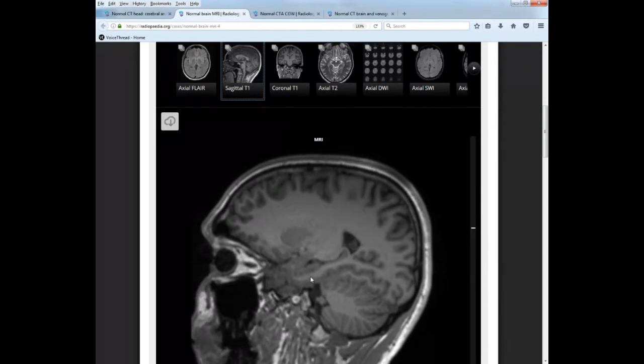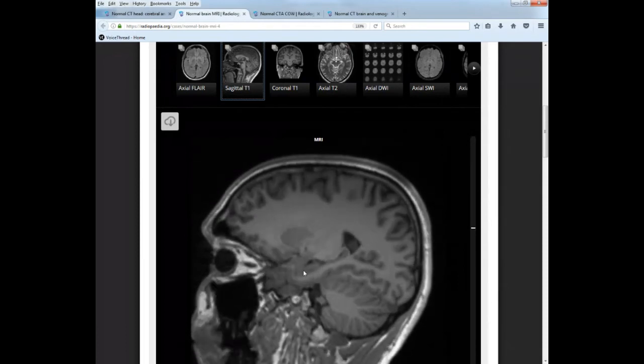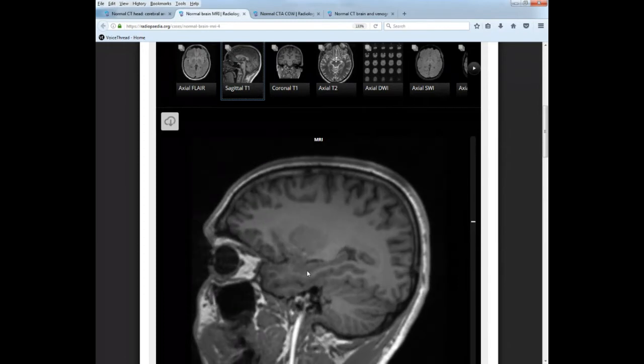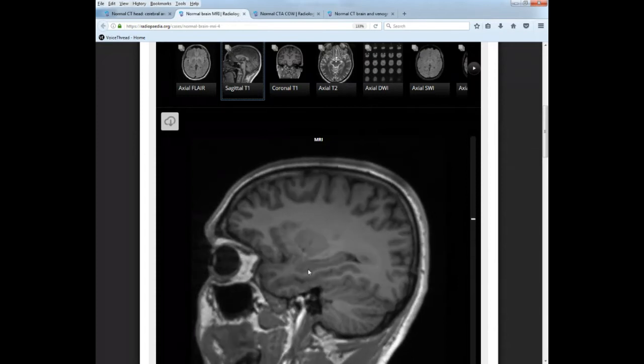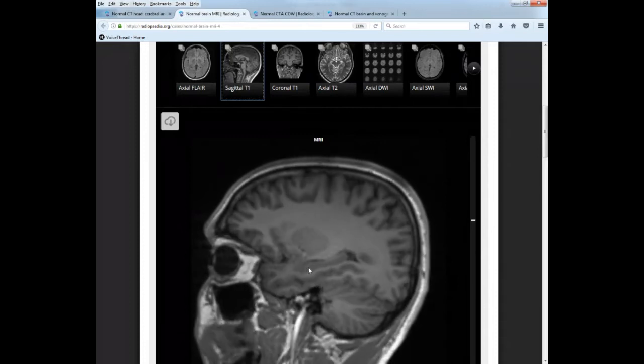Okay. Once you find that, you want to travel laterally a little bit and look at this almond-shaped guy in here. This right here is the hippocampus, and the almond-shaped portion anterior to that is the amygdala. Just superior to the parahippocampal gyrus, you have the hippocampus and the amygdala. The amygdala is this almond-shaped guy right here. All right, so there's that.